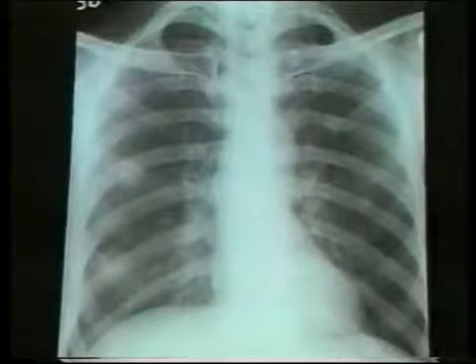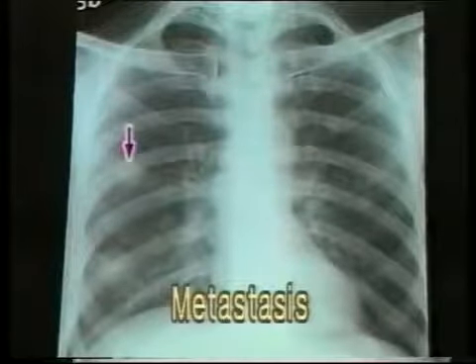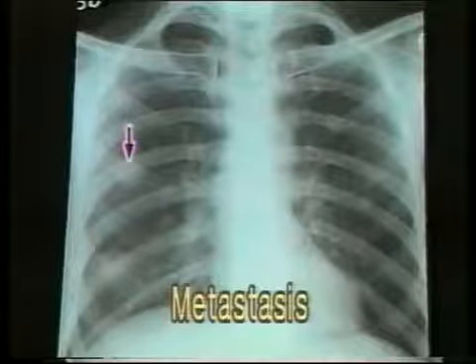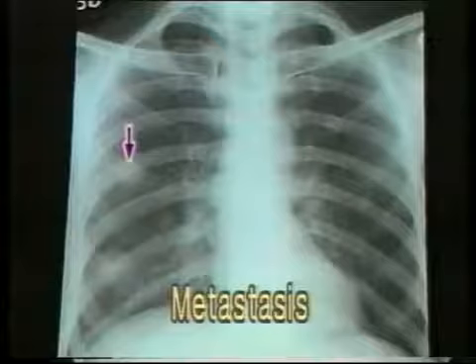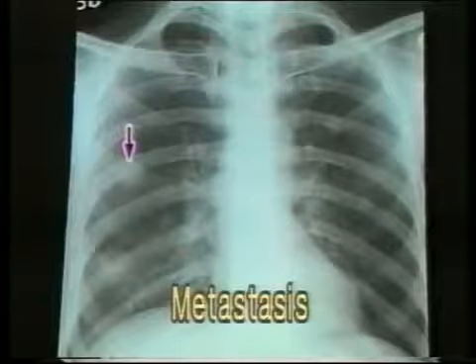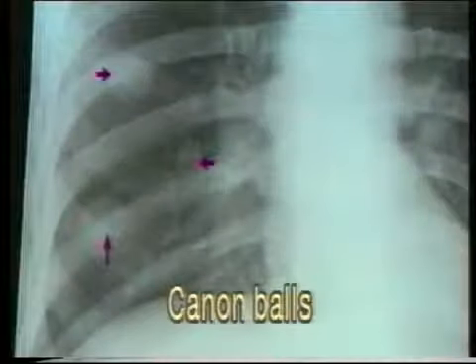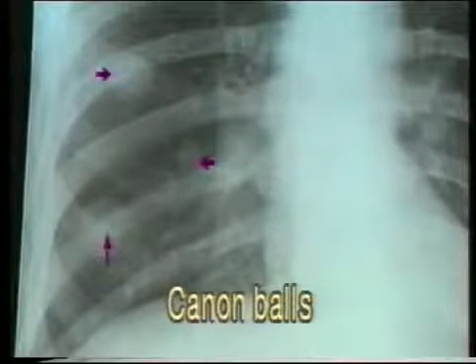Pulmonary metastases are typically spherical, that is rounded opacities termed as cannonballs or coin shadows. They arise from hematogenous tumor emboli which get lodged in the capillaries of the pulmonary circulation. This X-ray shows multiple but discrete, round, homogeneous opacities described as cannonballs. In the close-up view, 3 sharply defined rounded opacities are seen, typical cannonball opacities.